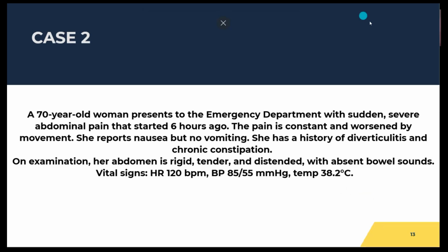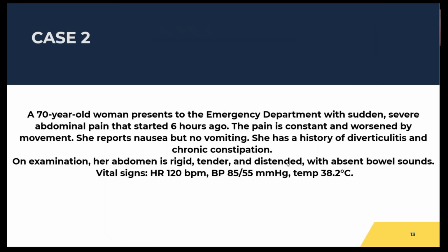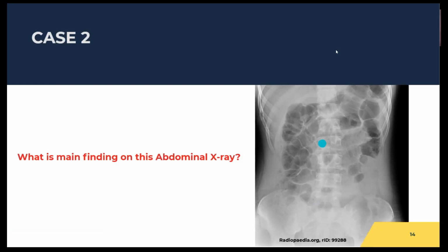Can I just put that on just for a little bit? Okay, so what is this finding? What is the main finding on this abdominal X-ray? So I'll give you a bit of time for this.